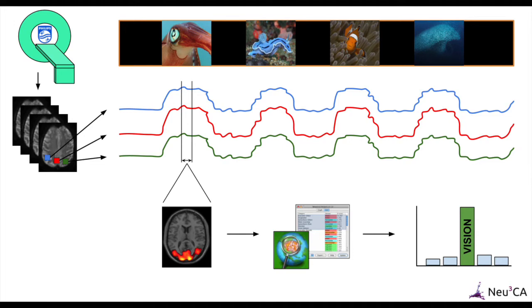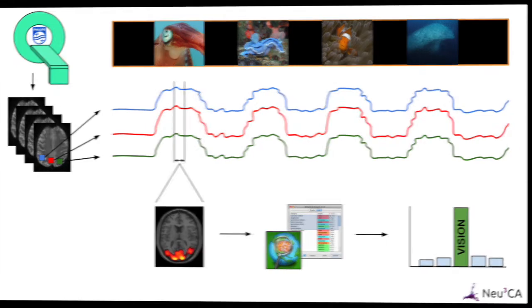We're trying to get a characterized brain activity pattern and then map that to the BrainMap database. And the brain activity is then described in terms of 50 behavioral profiles. And the set of behavioral profiles we expect to see activated most would be vision, because it's related to the experimental task design.